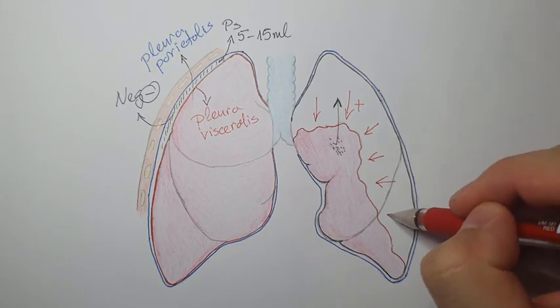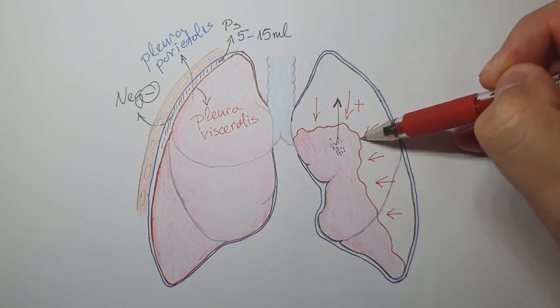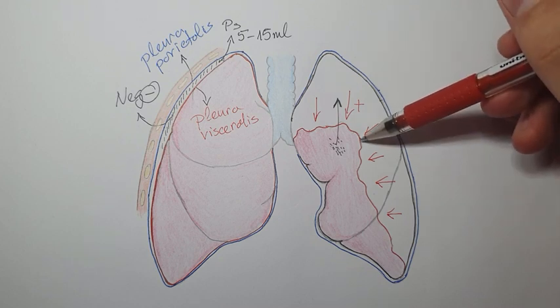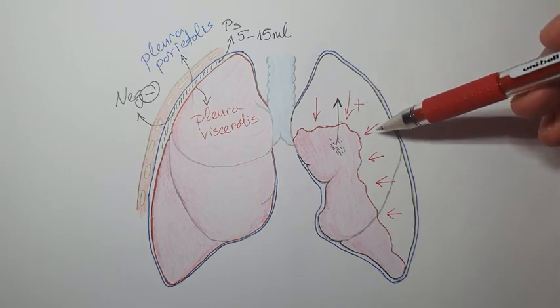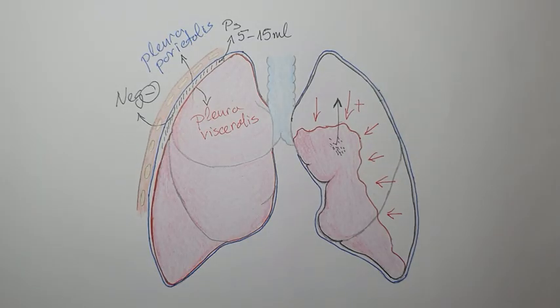And then we see that the line of the visceral pleura is not here where it should be, or actually on X-ray it is not seen, but it can only be seen once we have a pneumothorax that collapses the lung. So that is very important in this case.